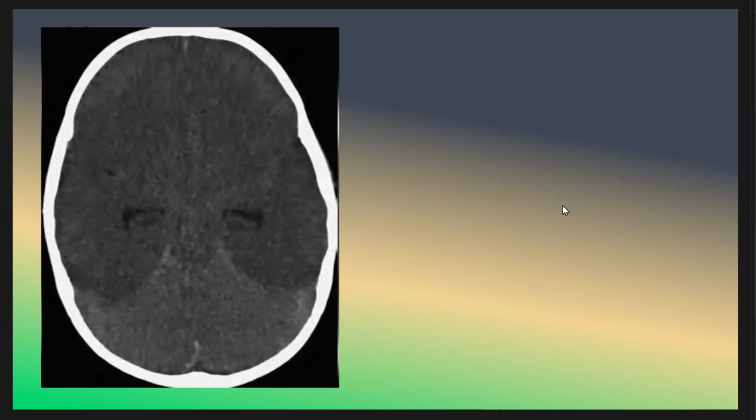Okay, and this patient has, as we see here, diffuse hypodensity involving the brain with sparing of the posterior fossa, and this is diffuse hypoxic brain injury, and this is the white cerebellar sign.